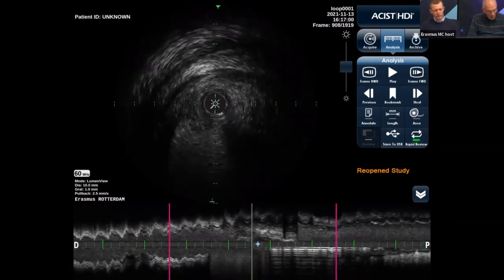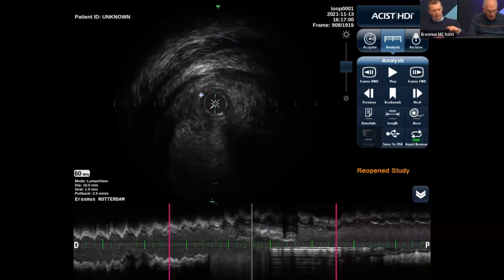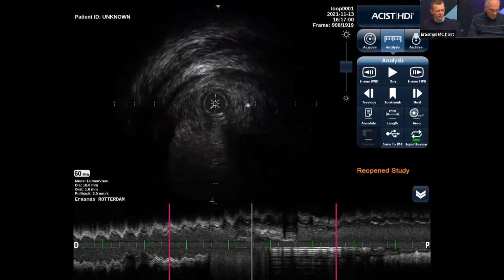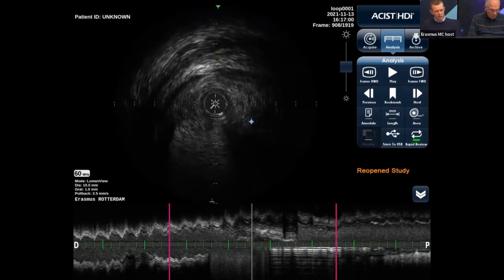how thrombus looks. Here you very nicely see the delineated black cloud on the left side, which is more like organized thrombus, but on the right side you have this sponge-like, meshy appearance of something that you cannot really identify. This is not fibrotic, it's not white, it's not calcified, it's also not white with a shadow, but it's blackish with some spongy-like appearance.